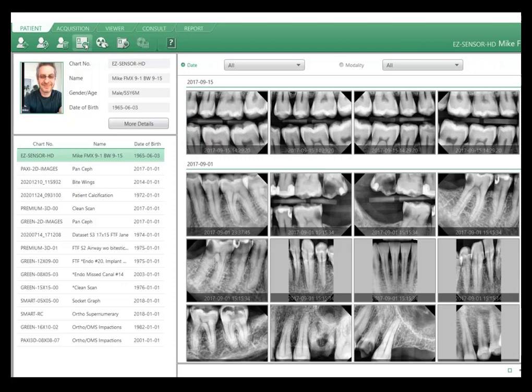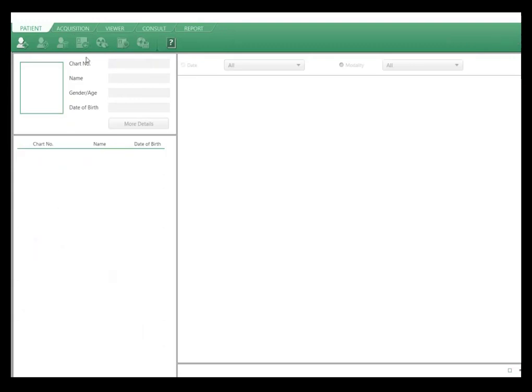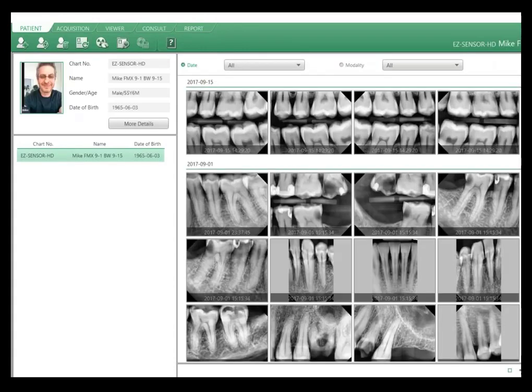The next icon after that is it's kind of a clear screen, or I like to call it kind of a HIPAA button. If you have, let's say, a screen up and you just want to clear all the names for HIPAA purposes, that's what that does right there, and then it will clear it out, and then I could bring my patient back up on the left side under the search box here.